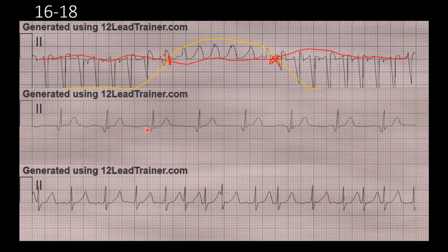And with a rate of about 80, I think is what we decided on, that would mean that this rhythm right here would be an accelerated junctional rhythm, because we have inverted P waves, a narrow QRS, and normally junctional rhythms would be at an intrinsic rate of 40 to 60, I believe.